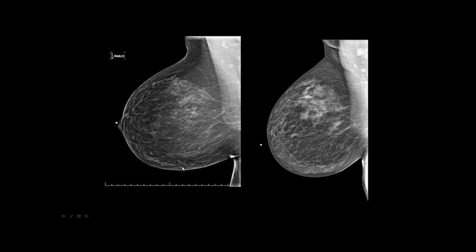When you look at the comparison of the same patient, different technologists, you can see it's better horizontal. Even in the IMF, it's more horizontal. The nipple's perfectly in profile. You can see there's no fold here created by the technologist. And there's a tail of the breast without a fold here. The muscle's more wide with the convex border down to the level of the nipple, your PNL, right here. That's beautiful.